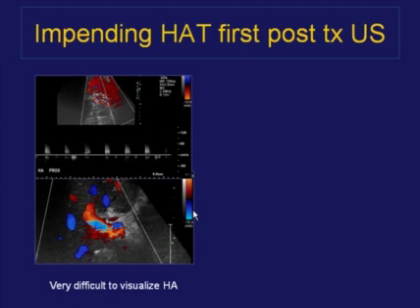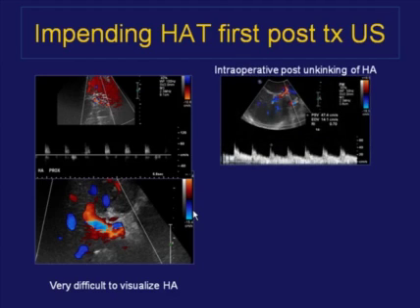We don't have contrast bubble agents to give, but the patient went back to the operating room, and they found that there was a kinking of the hepatic artery. It had seemed straight initially, then they sort of put everything in, closed the patient, and there was a kinking. They took out a piece of the artery and straightened it out. The immediate waveform on the table before they closed the patient reverted to normal with a resistive index of 0.7.